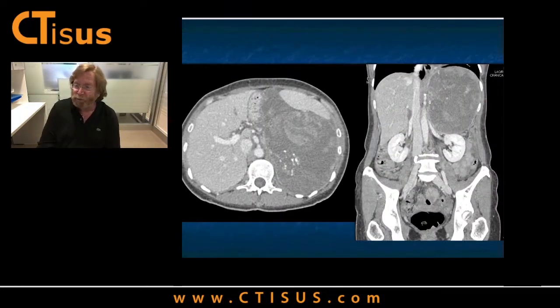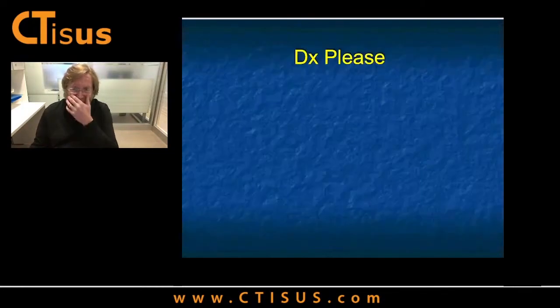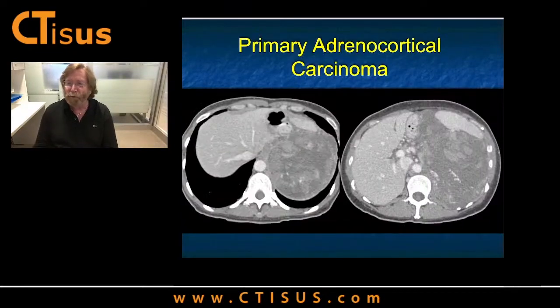But you also have to consider, what about adrenal? Well, if this mass is adrenal, and the coronal view, again, we love coronals. Coronals kind of tell you this is adrenal. What adrenal lesion has calcification, vascularity, and necrosis? You could consider a Met, but the Mets typically don't calcify. The mottled appearance, everything we're seeing. Here's some more images with 3D showing you the large mass, the varied enhancement. Everything you put together takes you right to the diagnosis of a primary adrenal cortical carcinoma. Just really a great case.